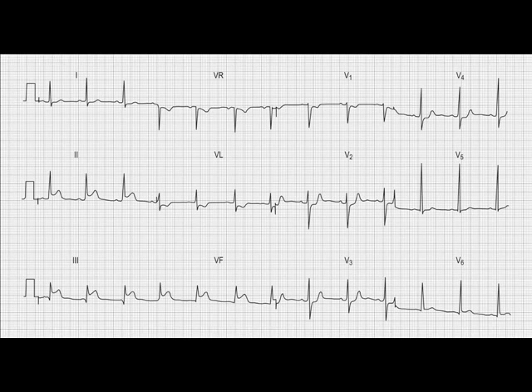Here's the next example, and let's look at this systematically together. Is it a clean trace? It certainly is. Nice sharp lines. Do they progress horizontally across the page? Yes, they do. A little bit wavy in the lines, but generally they progress horizontally.